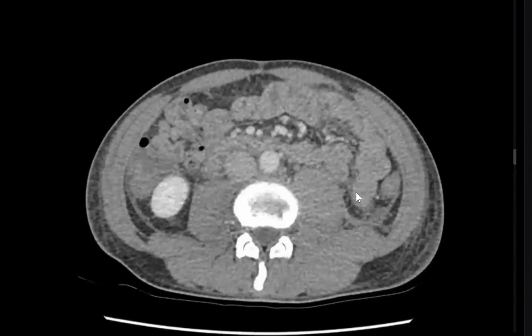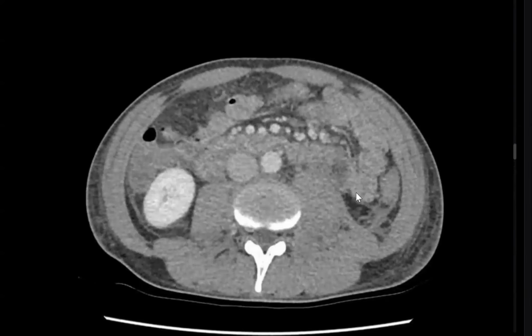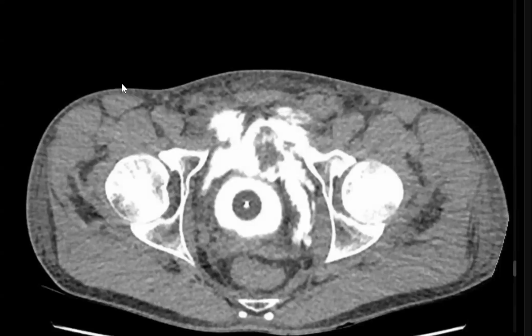In my routine practice, I would like to check the delayed phase. Yes, this is very important, either delayed, or the patient's vital signs may start to drop. Anything that may enhance the study instead of delayed, a cystogram. We can inject the contrast during the early phase even.